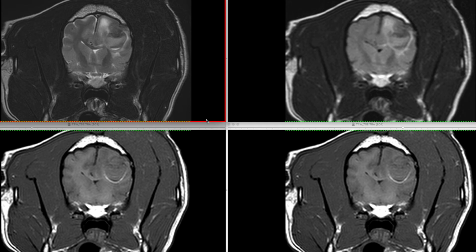If we look on the T1 weighted images, we have a rather unusual feature of this mass lesion here, in that we have this clearly defined T1 hyperintensity in this ventral part of the mass lesion. Now, T1 hyperintensity on a pre-contrast MRI is relatively uncommon and would often indicate that we're dealing with hemorrhagic lesions. So, when we have brain hemorrhage, the sequence we want to look at is the T2 star gradient echo.